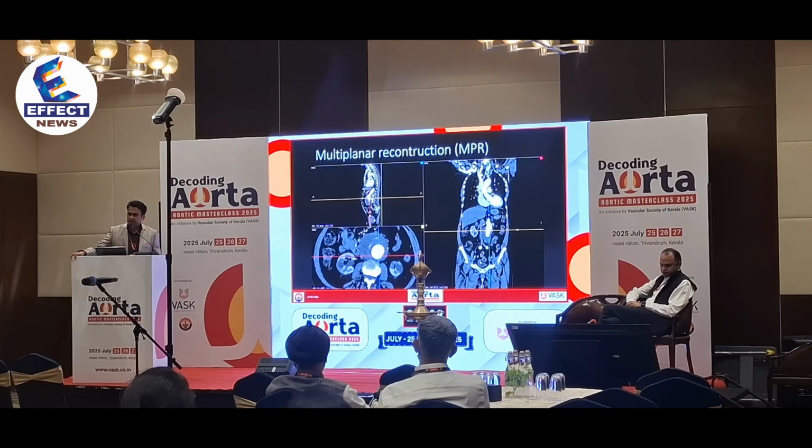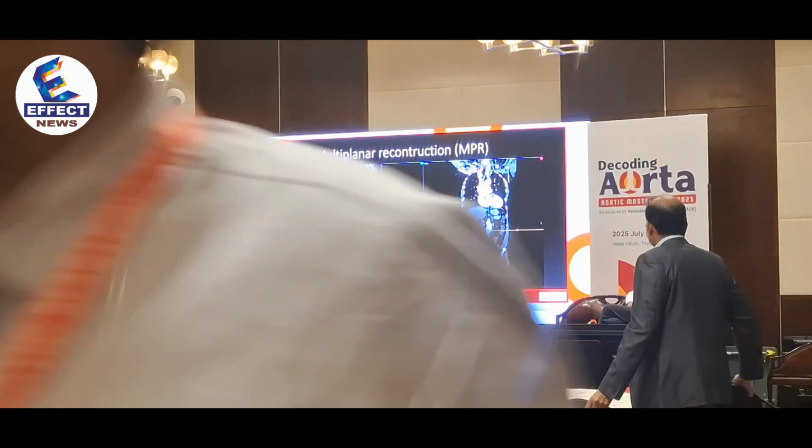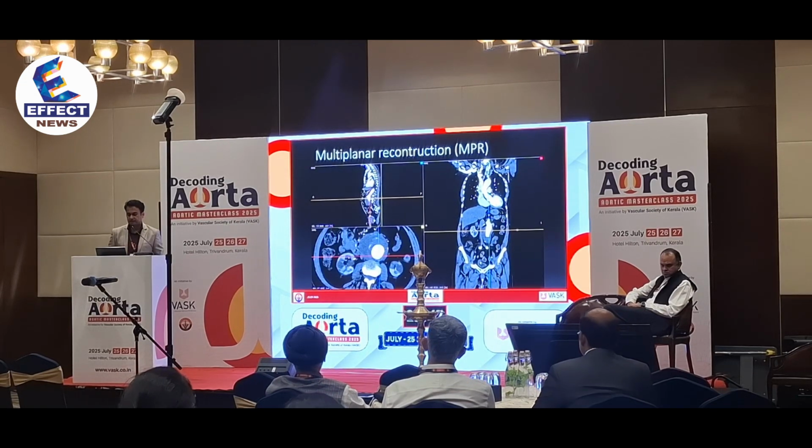This is sometimes already preloaded in the DICOM data or in the PACS. But if not, you can also use the axial images you have and software to reformat into these multiplanar views. So this is something that I've done in a software called Radiant DICOM. So you can see that the axial and the coronal and the sagittal are seen simultaneously. So you can scroll through one and simultaneously see what you're seeing in the other views as well.